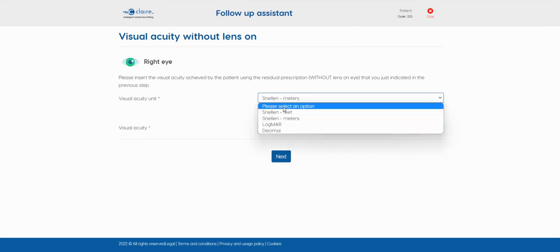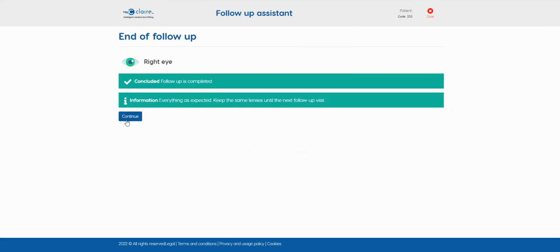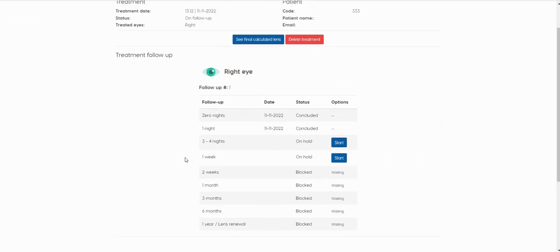And that's all. As you can see, every step, first exam, follow-up visits, renewal visits, can benefit from an immediate and live virtual technical support over the current lens that the patient is using at that time. Hope this video has helped you to clearly understand the high potential of providing virtual technical support to eye care professionals, who will be able to manage by themselves the vast majority of troubleshooting challenges. Thank you very much for watching. Bye bye.